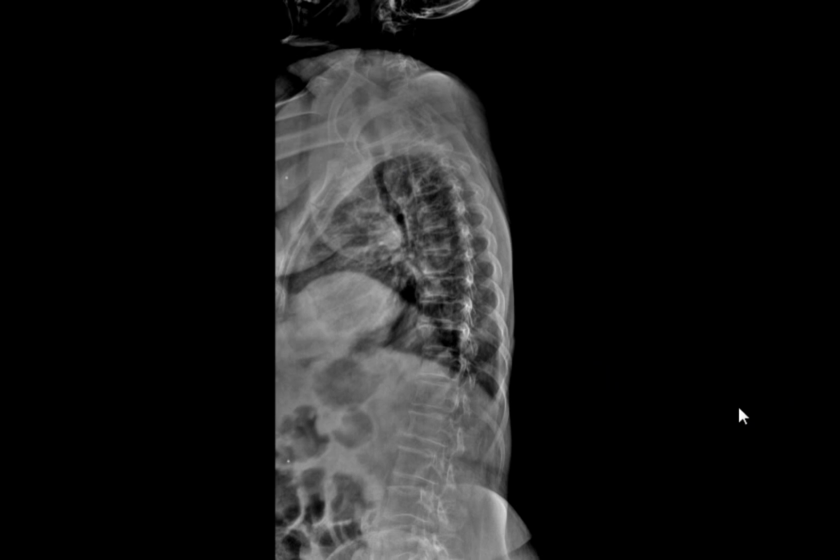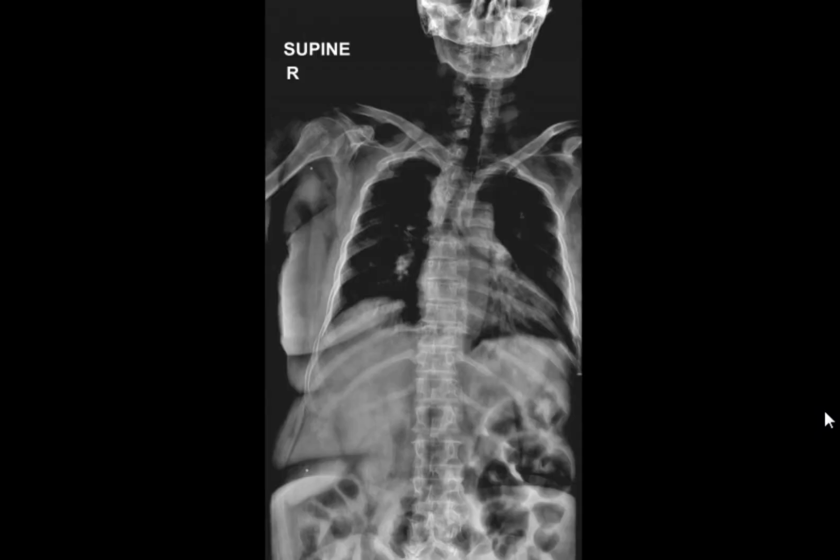Just scroll. Okay. Scroll. Okay. Do you see anything that, I don't know, attracts attention? This side, there's a bulging in the left. This is the aortic arch. Keep in mind this is overexposed because it's a spine X-ray, not a chest X-ray. So the aim is to see the vertebrae.